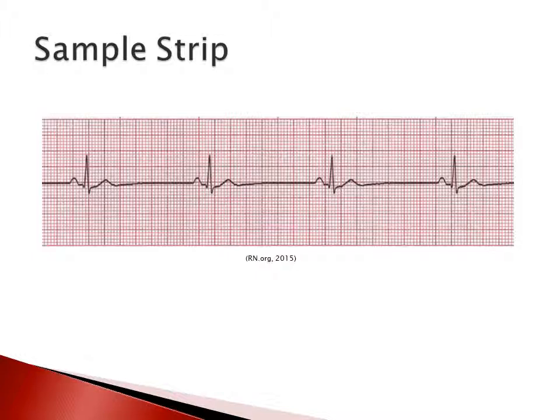And there are T waves present across the entire strip, and they are not peaked and they're not inverted. And finally, the QT interval measures 9 boxes, which is 0.36 seconds, and that's within the normal range of 0.36 to 0.44 seconds. So we have a heart rate of 40 beats per minute, which is slower than our normal parameter, and everything else is normal, indicating to us that this is a rhythm strip of a patient who is in sinus bradycardia.